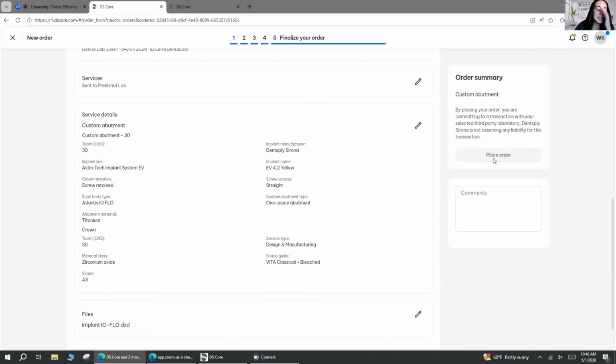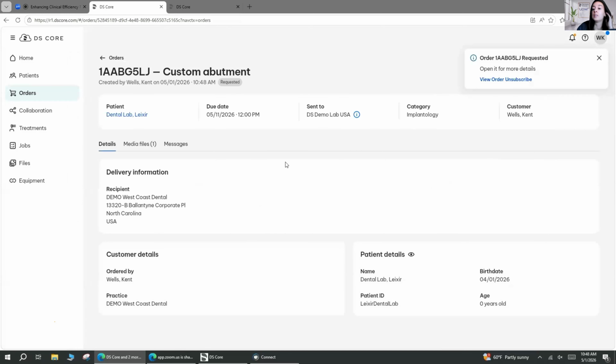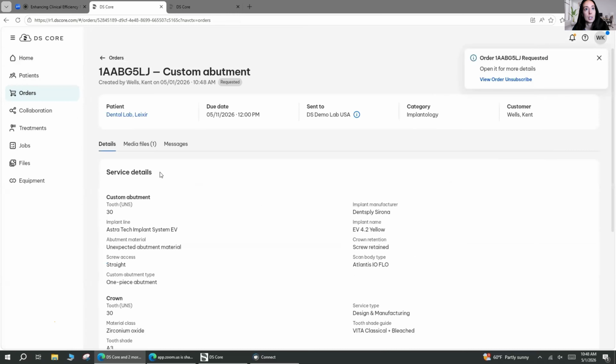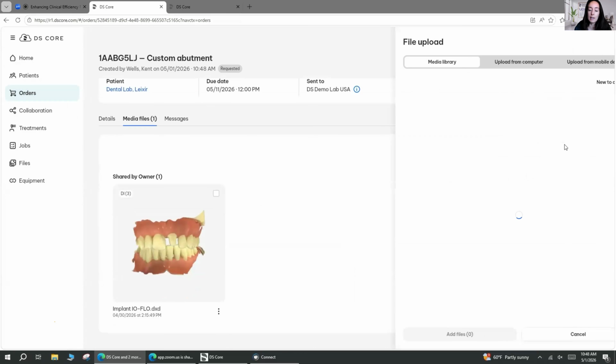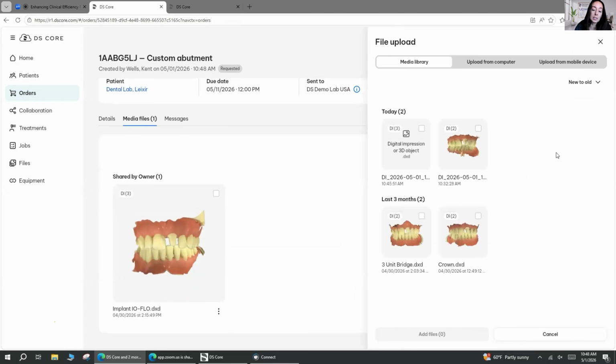I'm just gonna pop in here on the lab side with these scan bodies. Just like when you're doing an impression post, we always like to have an x-ray to make sure it is seated properly. So the same thing goes with this, and you can upload that x-ray right into this as well. Yep, good call out.